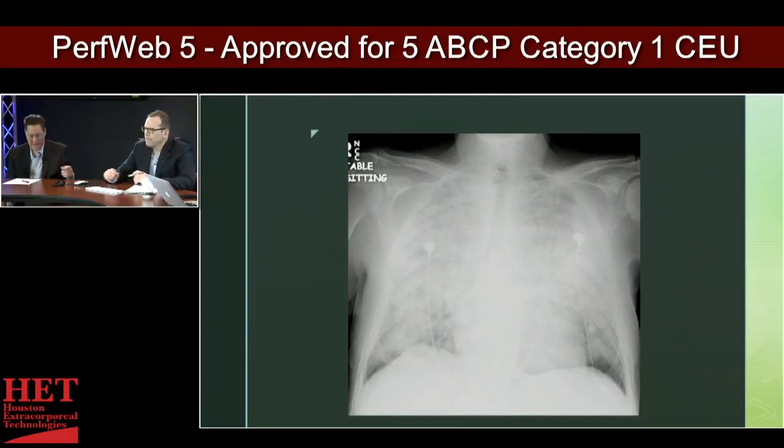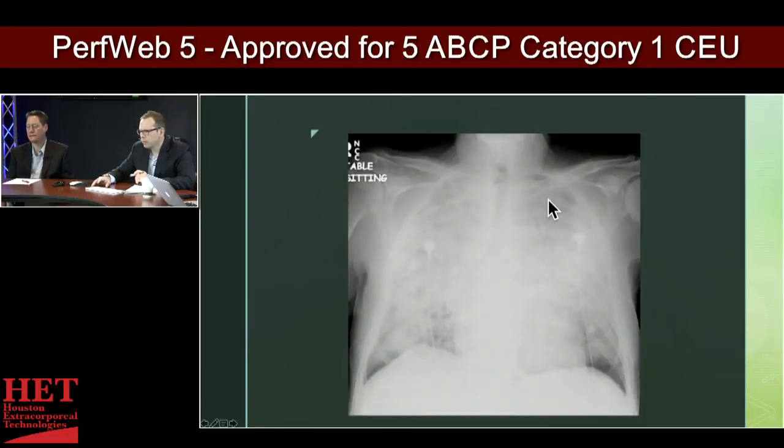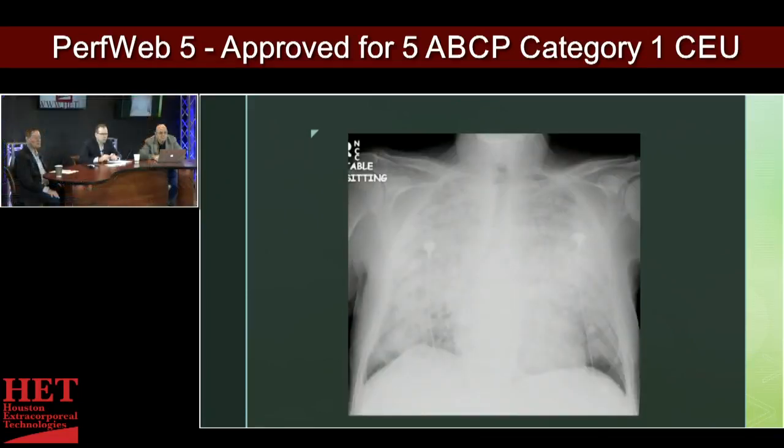I have a question. Is this patient intubated? Is that what I see in the trachea there? The dark area? So this is certainly the trachea, yes, and you can come down and you can pick out this is going to be the right main stem here, this is going to be the left main stem here. I do not see an endotracheal tube in this patient yet. Okay. You certainly have EKG leads that are there on both chest walls, but this patient is probably about to be intubated. Okay.